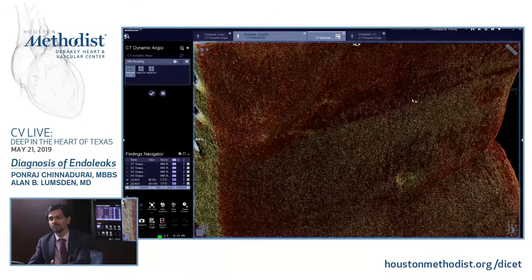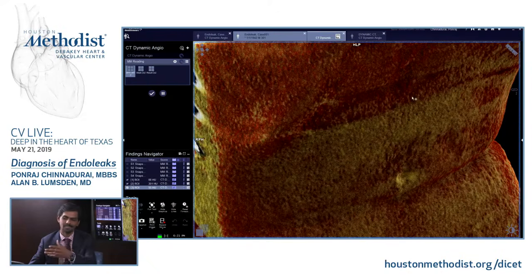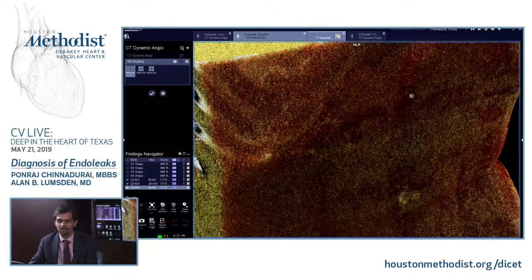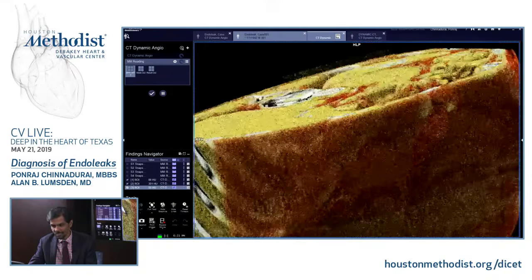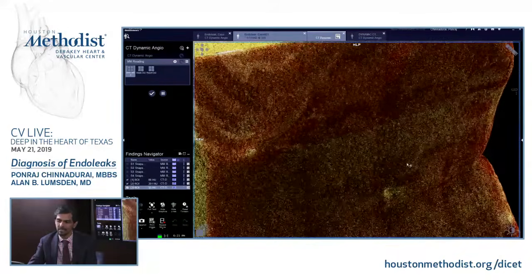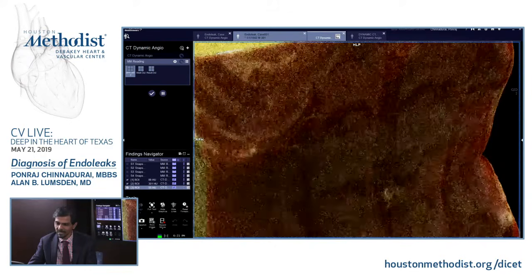Yeah, because I'm running on Wi-Fi on a laptop, and all this processing is done on a server that is remote. So it's not done in your computer? No. Okay, so what happens? This is just a viewer that we have that you're looking at, and you see the muscle, you see the ribs, and as I window this out, you will see that.